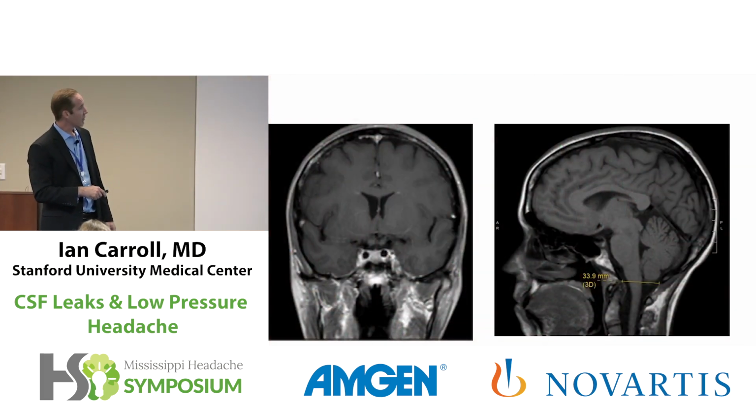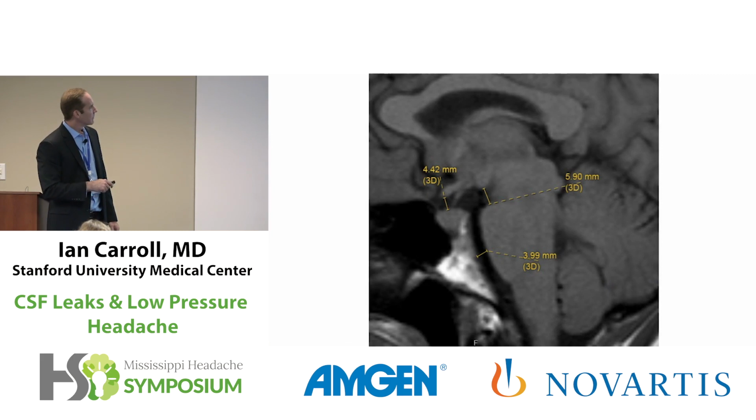So her MRI brain, again, no pachymeningeal enhancement. The cerebellar tonsils really are not below the foramen magnum. Her suprasellar distance is 4.42. Remember we said that the threshold for this is 4. So this distance is normal. This distance, the mammillopontine distance, is supposed to be greater than 6.5, not greater than 6.5. Prepontine distance should be greater than 5. Not greater than 5. Again, read as normal, but this was done before that paper came out. But I'll tell you, I think in most of the country, they would still read this as normal.